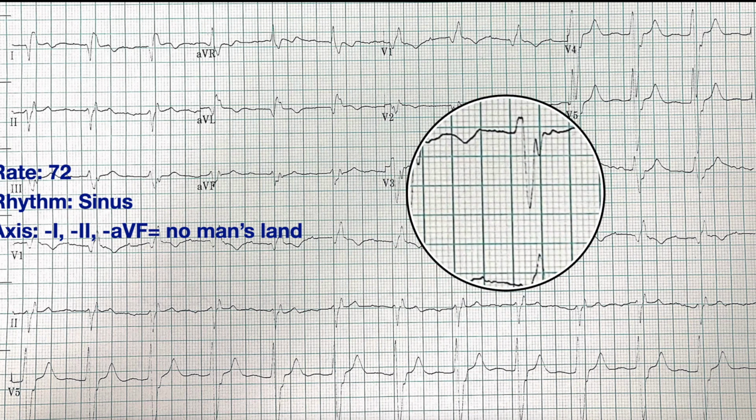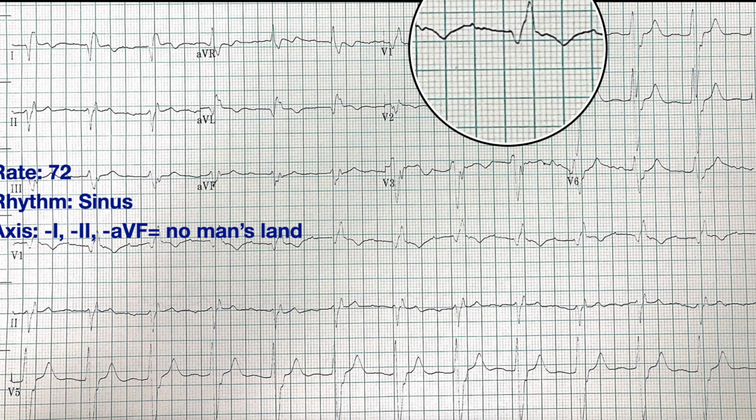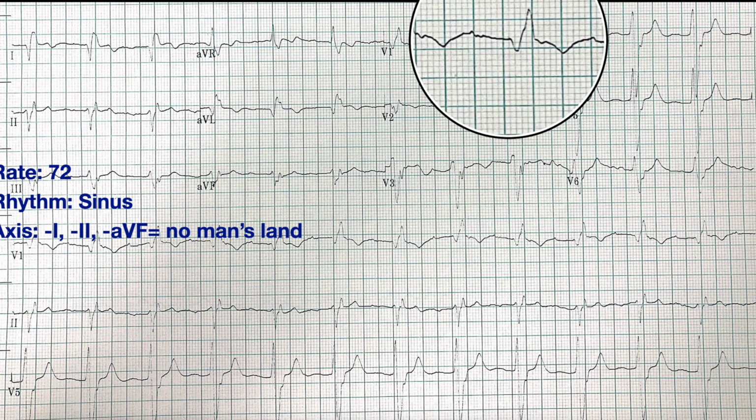Let's look at the QRS complexes. Again, we can pick wherever, but let's pick this one. From the start to the finish of the QRS complex, it should be less than three little boxes, and it's fairly clear here. So that looks like one little box, two little boxes, three little boxes, four little boxes. So this is a wide complex QRS.